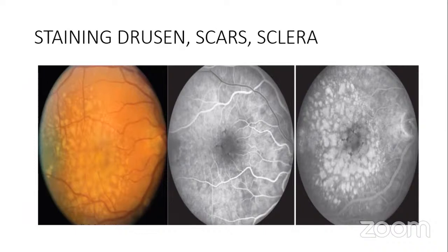If it is a large hemorrhage happening at the inner nuclear layer, what it will block is the hyperfluorescence from the arterioles, the capillaries, which are the vessels at that level, and then the choroidal hyperfluorescence. So that's for dot hemorrhage. One is hypofluorescent, one is hyperfluorescent. That's what makes the difference there.